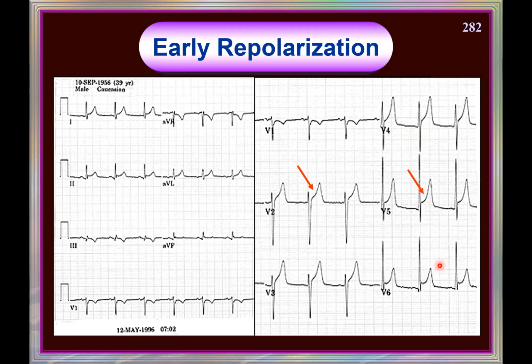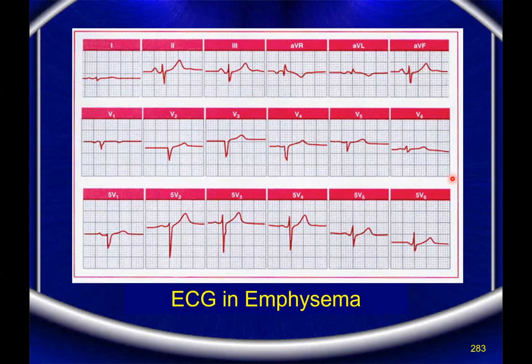So beware of this early repolarization. And how do I interpret this? There will be no symptoms related to the ST elevation. T waves are absolutely normal, and along with the ST, the T merges and they are pushed up. That is how we record here.